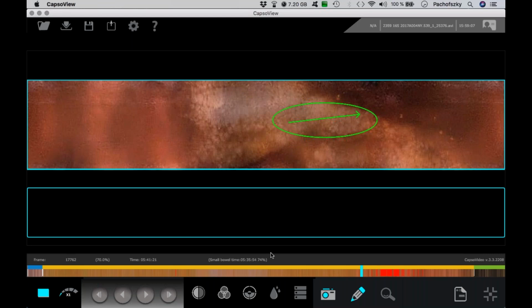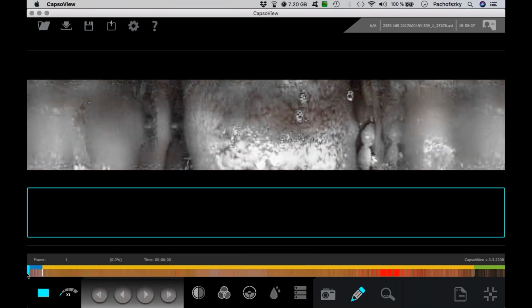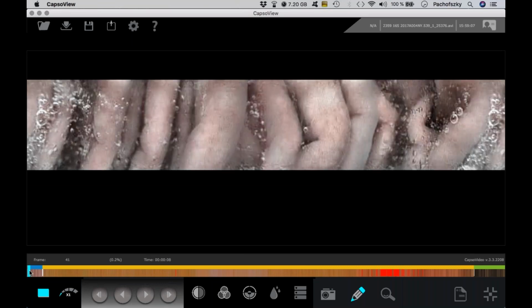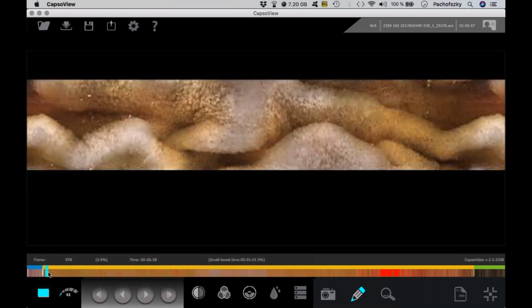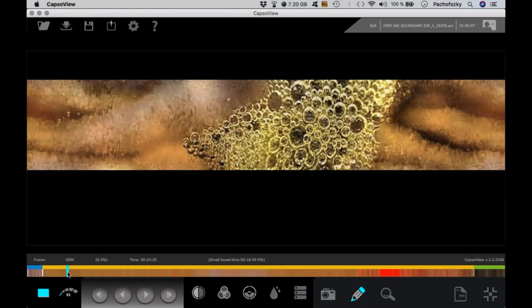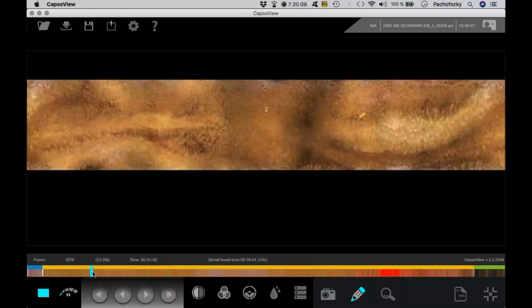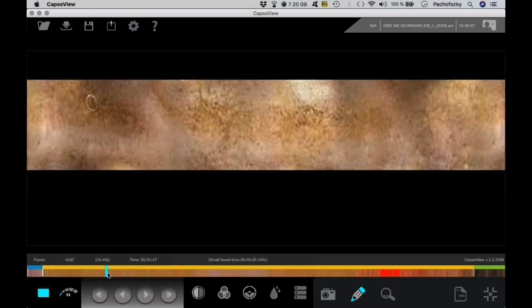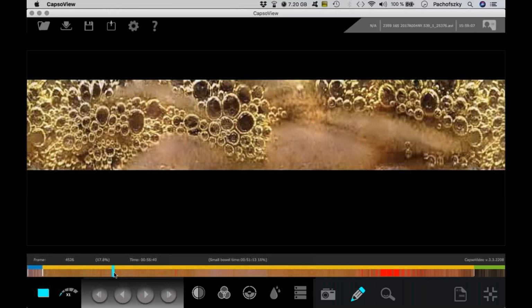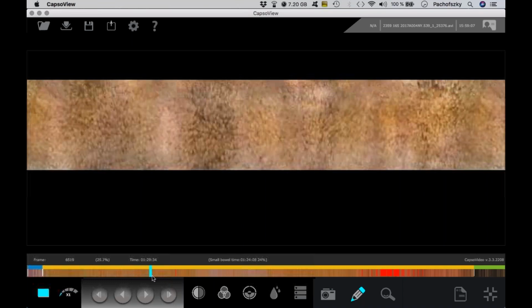So how I'm going on with a new capsule, I will show you. First, when I start, I do it every time the same. I click here in the bar and go on quite slowly, because with this often I can see a lot of pathologies within some minutes. And even if the red detection is not so perfect, you can also see if there's an ongoing bleeding.